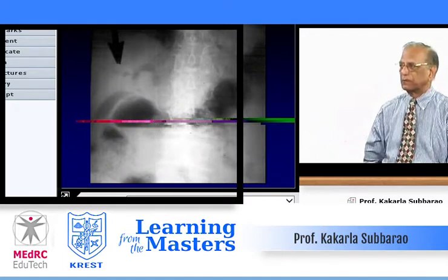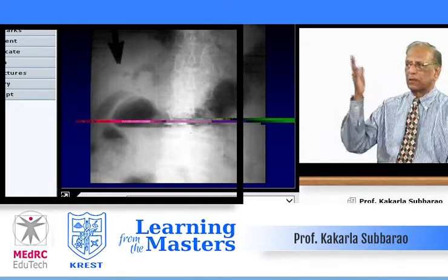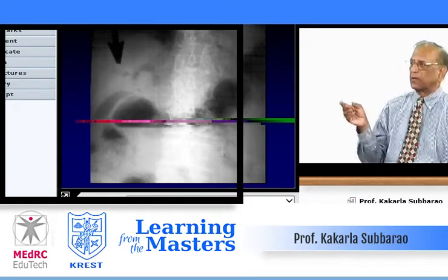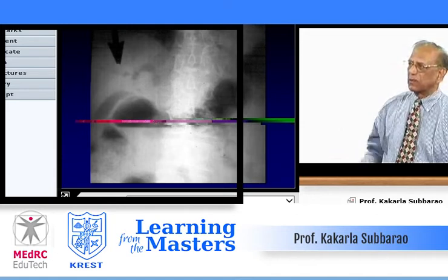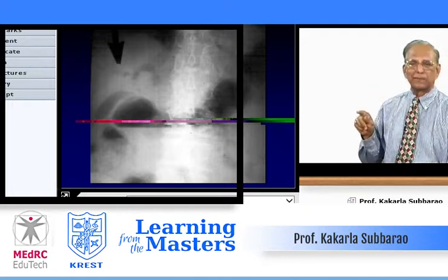And then perforation or intestinal obstruction, acute abdomen. You take routinely a supine view and erect view, and sometimes decubitus lateral views. And in this particular case, we can outline the gas in the stomach. But if you look carefully, in the right upper quadrant, there is air in the biliary tract.